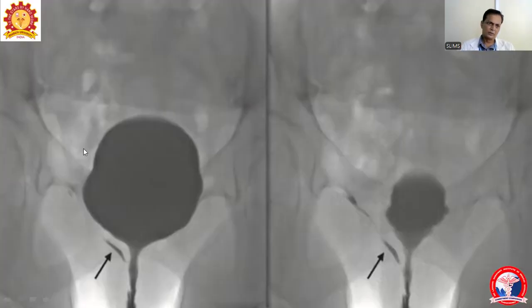Here we can see the image. We can see here the ureter, rather than inserting somewhere here, is getting all along down, and insertion is seen in the post membranous urethra, where like dilated almost bulbar urethra region, it is showing the insertion. So incontinence or dribbling of urine will be seen in these patients.